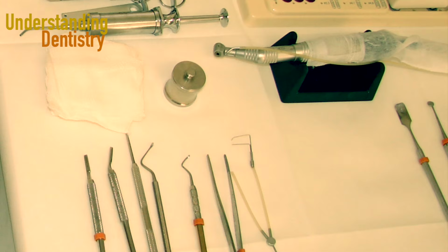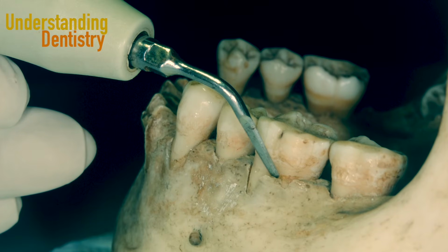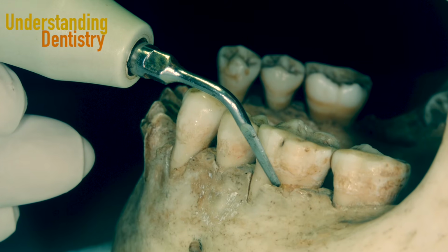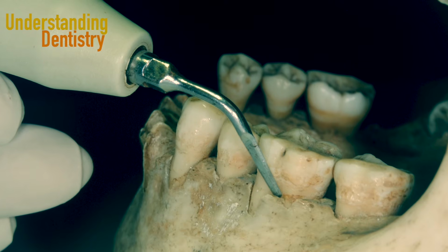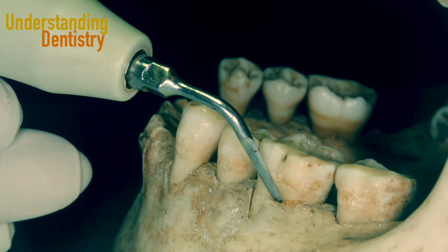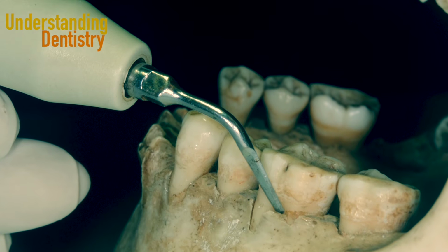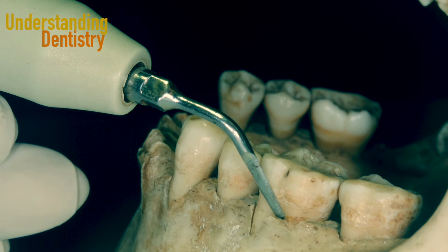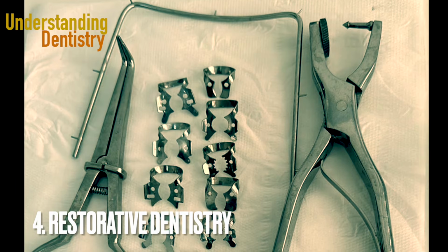Then you are going to use burrs, even for the dental implants, and this is a piezoelectric surgical device with the tips to do osteotomies, okay? So they do osteotomies without affecting soft tissues. They are very useful for extractions and even implant and bone graft procedures. So you should be always reading about this to learn about new technologies and new instruments that are coming all the time, okay? Let's go for restorative dentistry a little bit, and even endo.